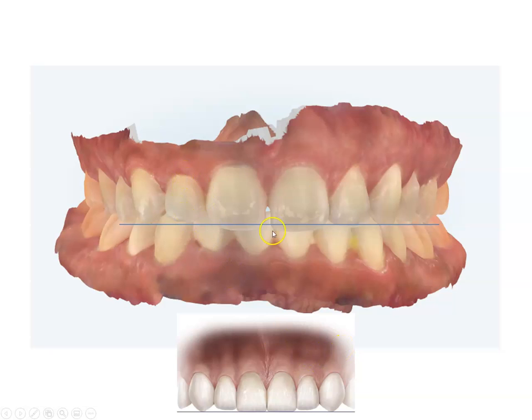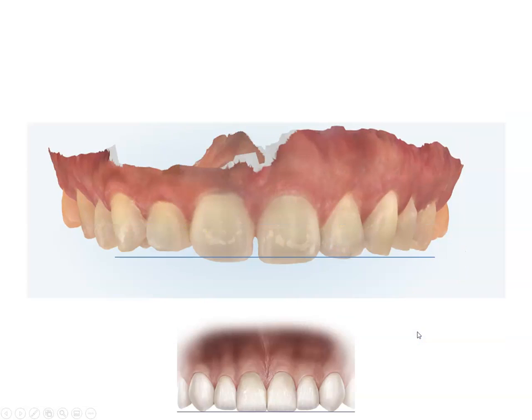As we could see, this tooth is pretty short and this one's pretty long, unless we end up moving her teeth and then doing some gum tissue treatment and maybe doing some shortening of her teeth. Now, if we continue and we look at just the teeth, we could better see what's going on, and we would probably need to lower this a little bit and line the teeth up, but we are looking for this evaluation. And when we're doing her real evaluation with Invisalign, you guys will see how we're going to work our way out of this and try to get her a nice, beautiful smile.